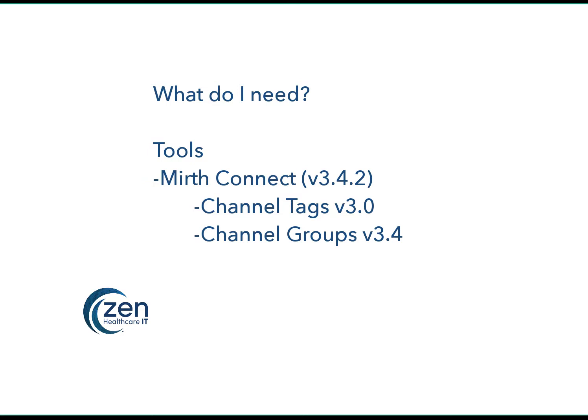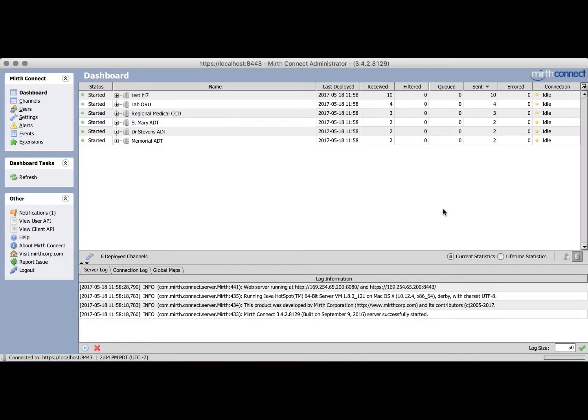Version 3.5 of Mirth Connect is scheduled to have some improvements to both channel tags and groups. We'll be touching on those updates in a later video. Now, let's take a look at a demo using both channel tags and groups.